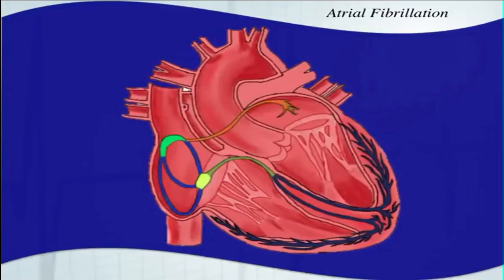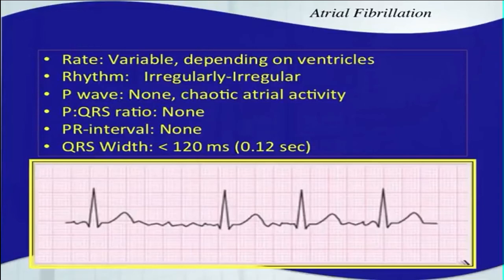So it doesn't typically have pacemakers that are just randomly occurring. In fact, if you think about it that way, it might help. But really, it's just the entire atria are constantly quivering, sending signals down to the ventricles almost 800 times per minute, and hopefully the ventricles are only picking up some of those. And this is what it looks like. You sometimes will have what we call a fibrillatory wave instead of P waves, or sometimes it's completely flat.